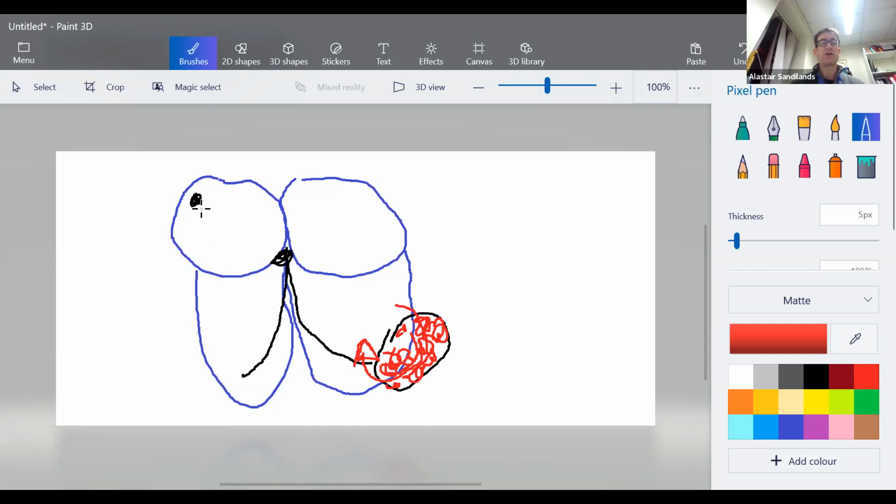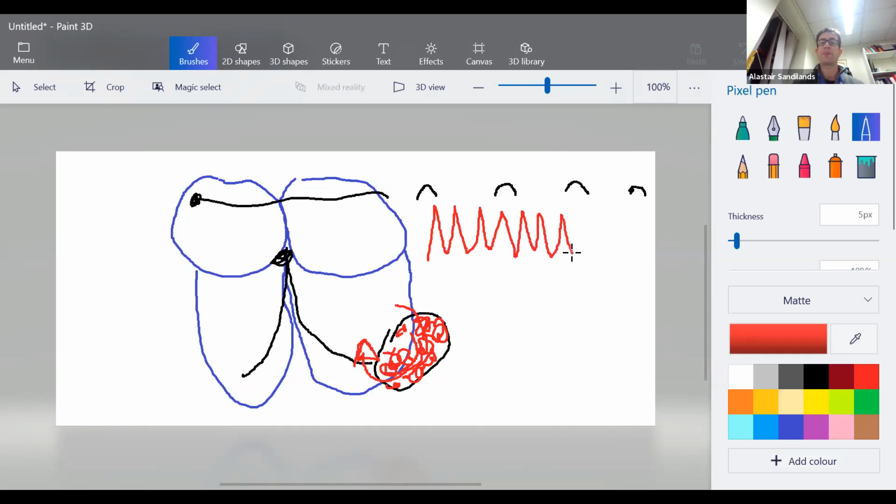There's two ways. We look at the sinus node firing. When the sinus node fires, it will fire independently, and so we'll have a P wave going along at about 80 beats a minute, for example. So when we look in V1, we might see evidence of a P wave, but that's independent firing, and we have to mix that with the VT occurring. So this is the VT, regular broad complex tachycardia.